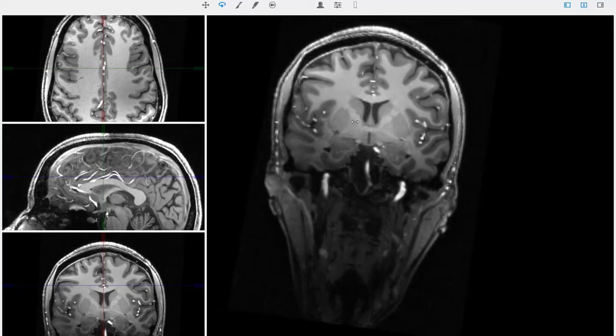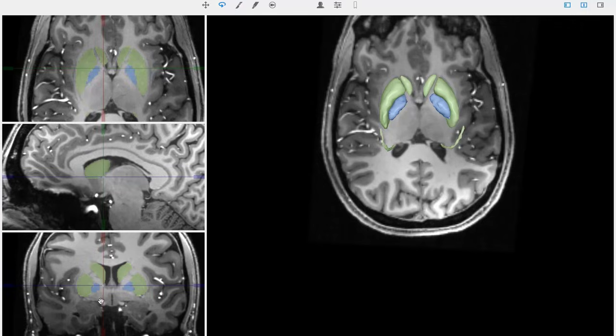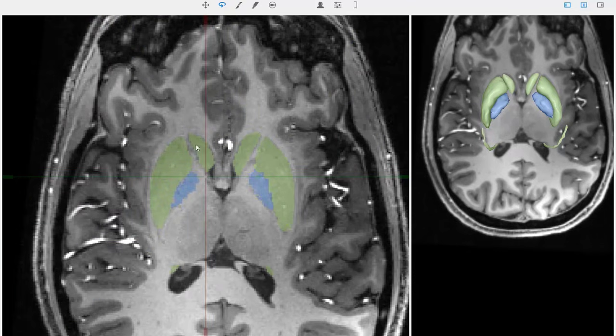And there, do you see that lighter structure here? You can see now caudate, putamen, and globus pallidus. And you can see that it's not until we're pretty far down through the brain in a fairly inferior slice, axially, that we can see caudate, putamen, and globus pallidus.